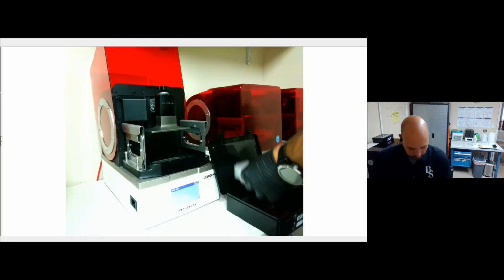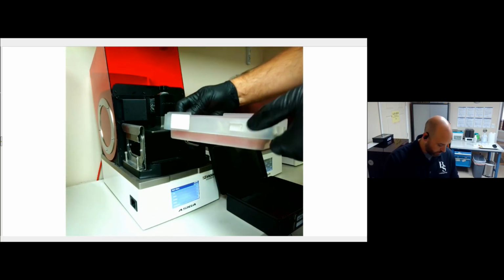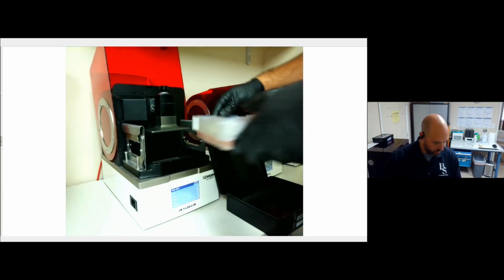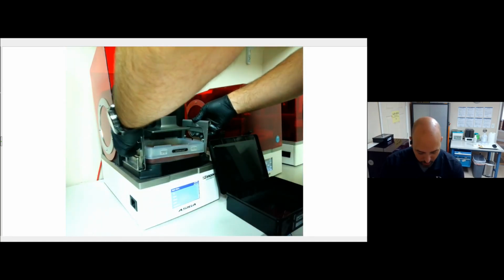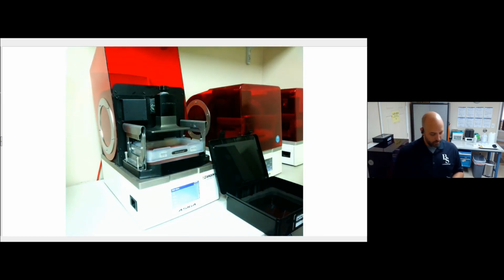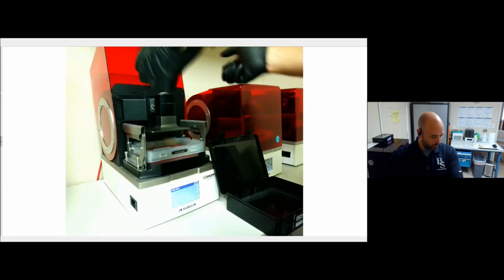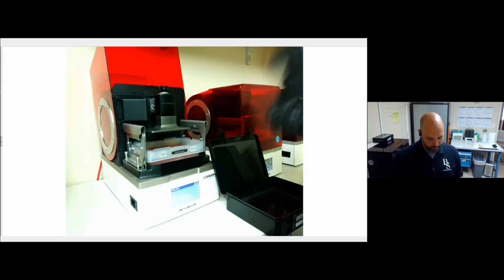So here's my tray. Outside of the container, you'll notice that there's an RFID tag here, this white label. That has to go to the back right corner of the printer, and then you'll want to latch it down with these handles that are on the sides. Now, the newer Maxes have different handles, so it could be a little different. Those are slide locks, where these are lift and pull in, and then there's little washers on each of the corners here that hold the tray down in place.